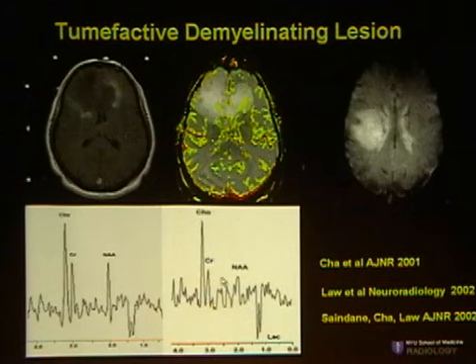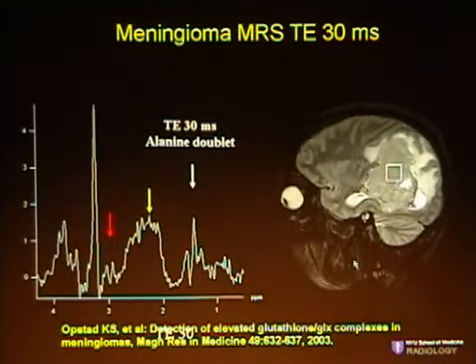And when you look at the NAA levels, NAA is probably not as reduced as in a very high-grade tumor. And more importantly, when you look at the perfusion map, if you see these little venules, and I think a few people have already shown you that today, if you see these little venules running through the lesion, you can be pretty certain that you're dealing with a TDL.